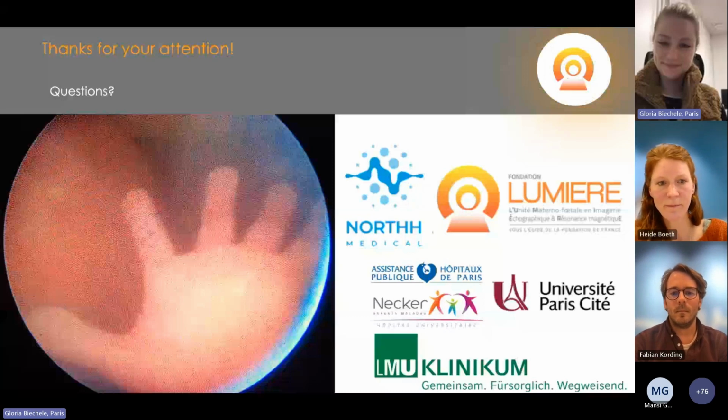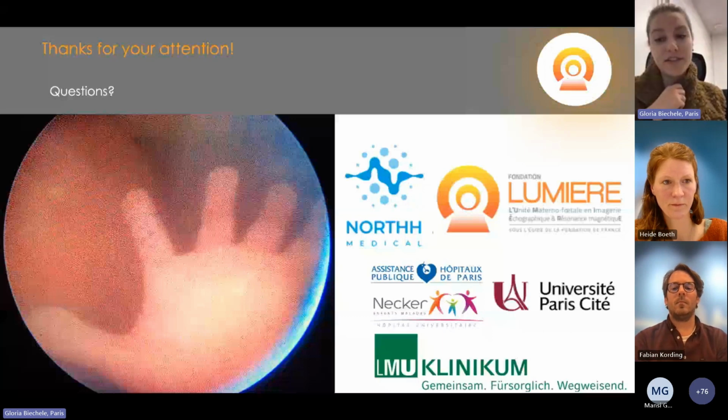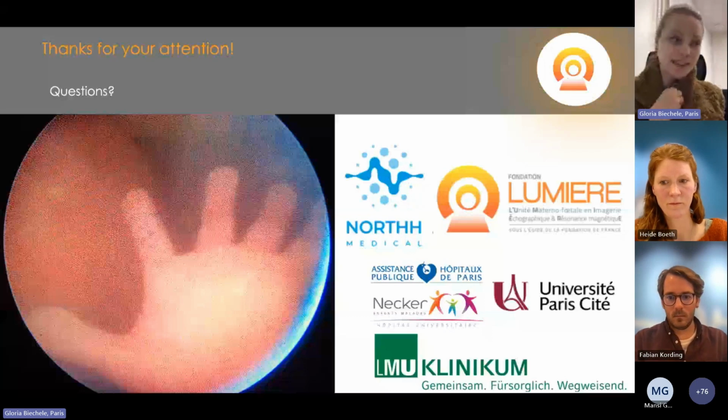Maybe I should also mention that the clinical part of the MRI already had a duration of about 40-45 minutes. And then we just started with the heart sequences and installed the transducer and all that. At this point, the woman was already about 50 minutes into the machine. So I think it is evident that these were not the perfect sequences, and she was not able to perfectly hold her breath. And I think this is quite understandable.